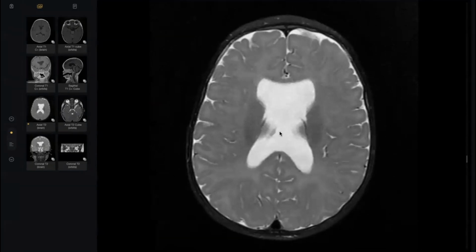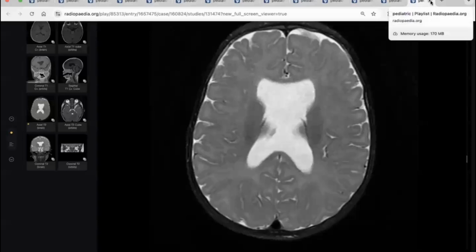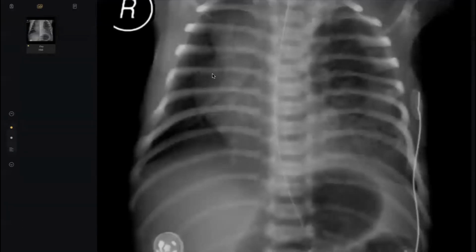What happened first? First, we see absent septum pellucidum. Then we confirm the atrophy of the left optic nerve. So a diagnosis of septo-optic dysplasia was made. This is related to holoprosencephaly, because this is a midline abnormality. Okay, my colleague? I mean related to the group of midline brain abnormality. Thank you, doctor. Next candidate.